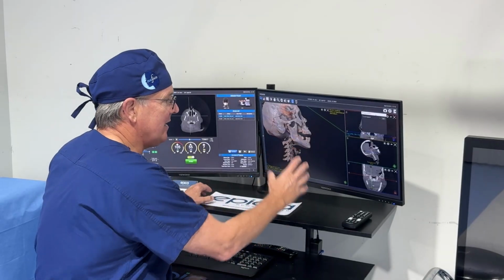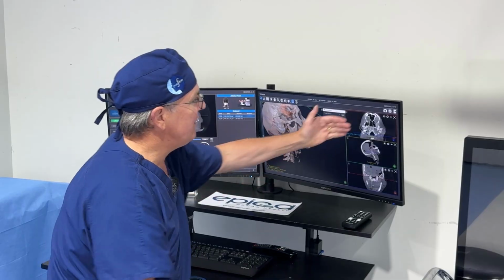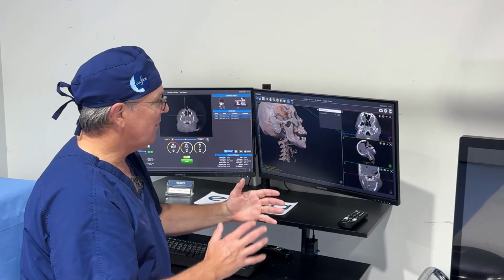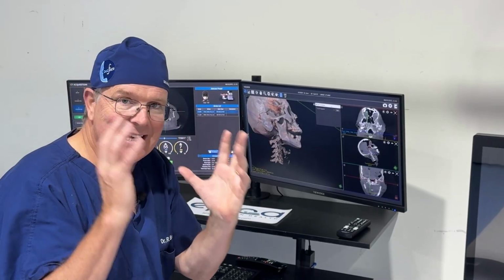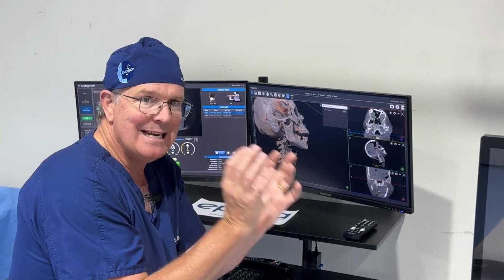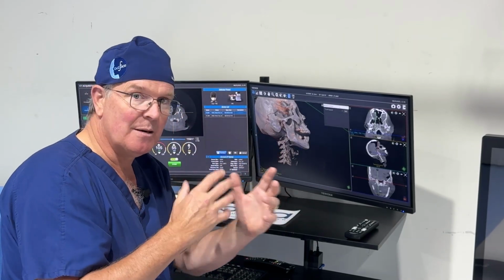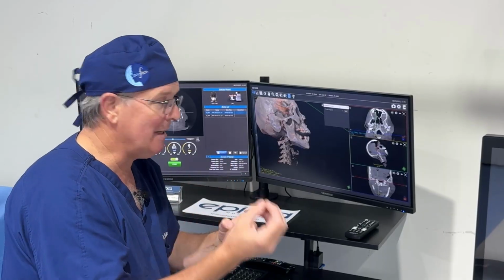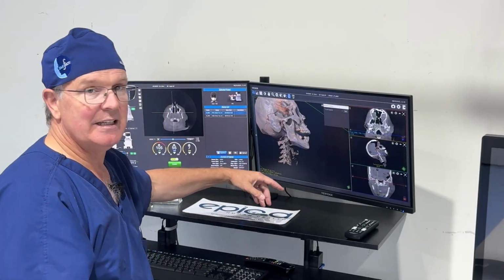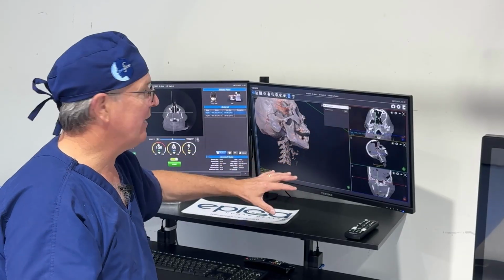And here we can see these are 2D images of the CT scan, which can give you the anatomy, bony anatomy, and then you can measure it and come up with different specifications that you're looking at manipulating. And so specifically for me, what we're working on is improving this cervical mental angle.